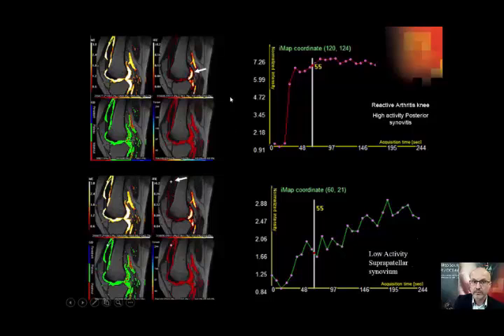But if you place your region of interest behind the knee joint in the capsule, where the tendons insert, you actually see very steep enhancement curves that are even steeper than the corresponding artery behind the knee joint. This will help you if you want to go for biopsies. Why don't you go for the most perfused areas instead of a more standard approach, where you usually take the biopsies in the suprapatellar pouch because they're more easily assessed?